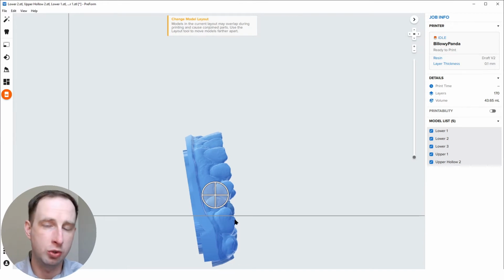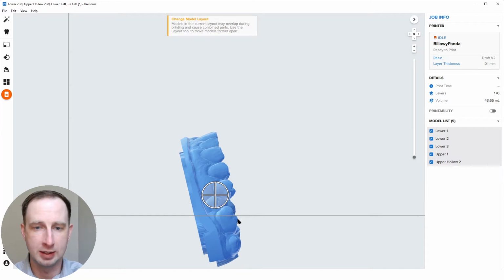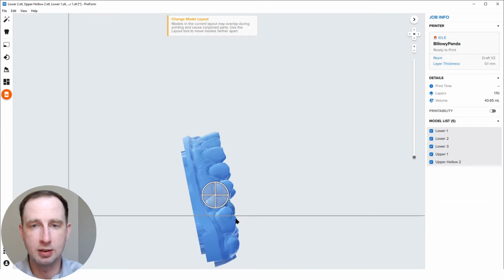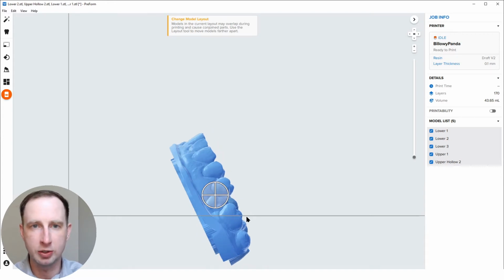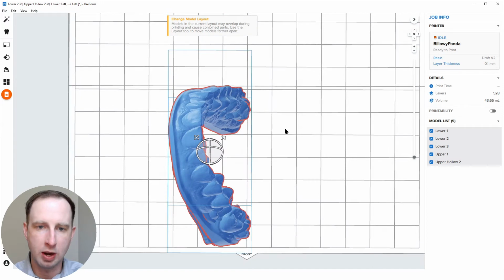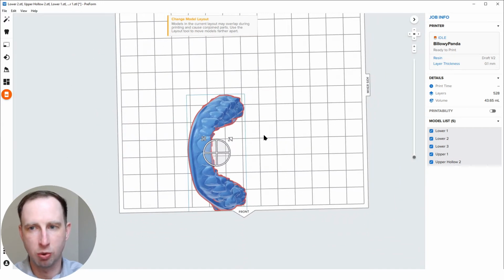And I will usually, and I'll show, I want to remove all supports from anatomy. I don't want them on the teeth of the models I'm printing. So pick what's best for you. If you want to cram as many as you can, and maybe the supports don't matter as much, go pretty close to vertical, maybe 85, maybe 80 degrees. But if you don't have that many models to put on, maybe a slight lax in angle like this. So once you're there, you're now ready to start generating supports.